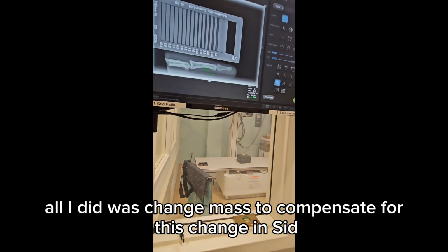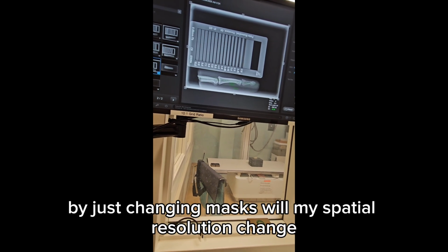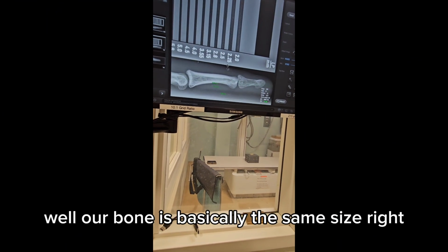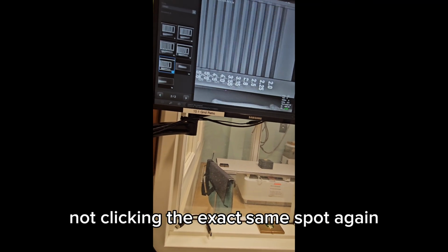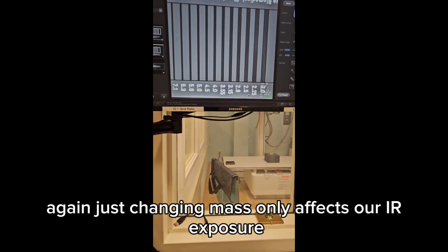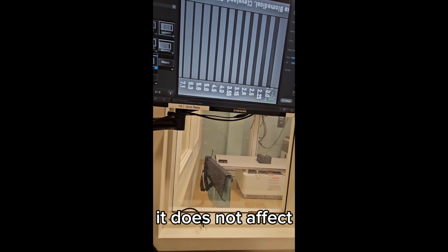All I did was change mAs to compensate for this change in SID by doing direct square law. So the size of the bone is still the same. By just changing mAs, will my spatial resolution change? Remember, that's the only thing that has changed between this picture and the last. Well, our bone is basically the same size, right? Obviously, room for error for me not clicking the exact same spot again. But we should still see our spatial resolution at 3.55. Yeah. Again, just changing mAs only affects our IR exposure. It affects nothing else. It does not affect distortion. It does not affect spatial resolution. Nada.